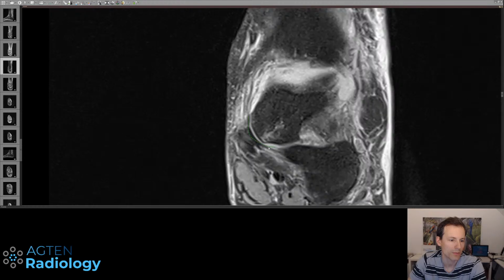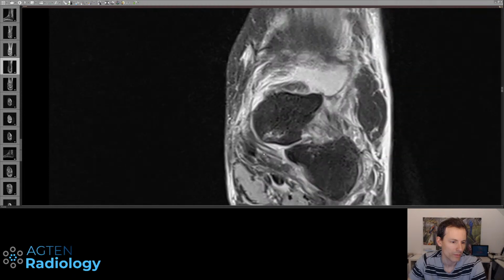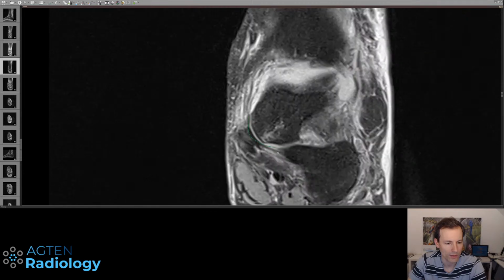There might be some edema down here, but the sustentaculum portion itself here looks fine. Also, this gap here is not indicating a tear, but it's sometimes just a spring ligament recess, which is normal, because we have this ligament that is running obliquely, and therefore we are cutting it out here, when on the next slide it's coming back here and inserting nicely there.